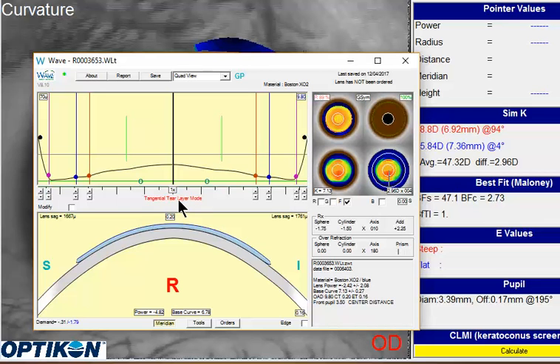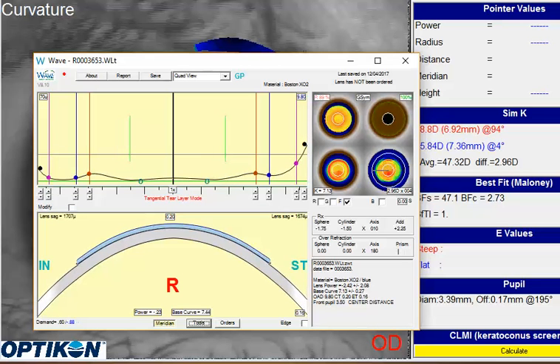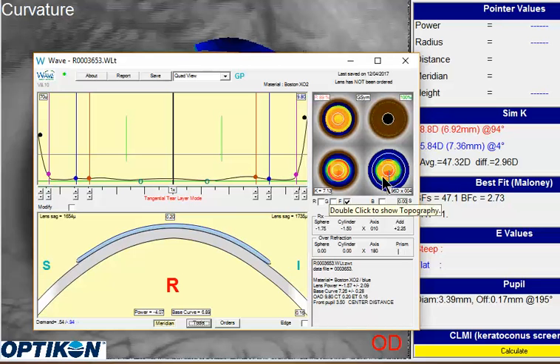So I'd probably recommend leave it in tangential, click over to Tools, hit Redesign, Current Settings, and we'll let Wave remap this lens out. And now you've got a lens. You got a couple little bumps up here in the red to blue area in this landing zone, preceding this landing zone.